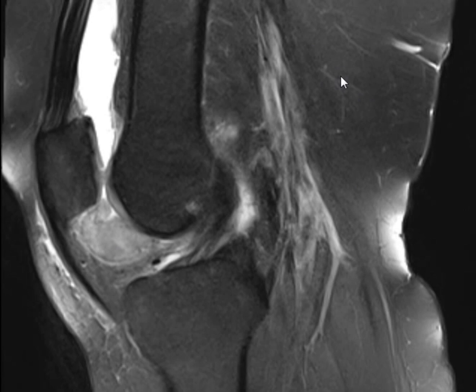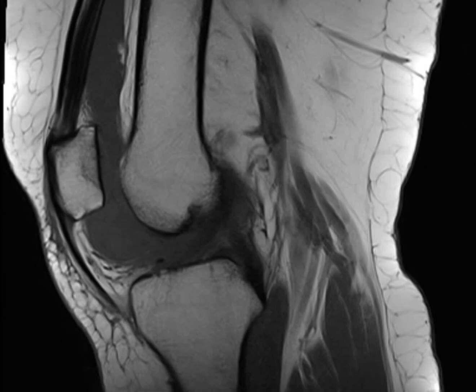Is this the same as this? Not suppressed. This is not suppressed. High first. Second, this is a T1. It should be what? Hyper. Is this hyper? No. Is this fat? No. Is this the same? No. So it's fat or not? Not fat. So we have what? Either blood or soft tissue. Soft tissue what? Mass, lesion, nodule, pathology, something? Yes. So we have a lesion. Where is it located?